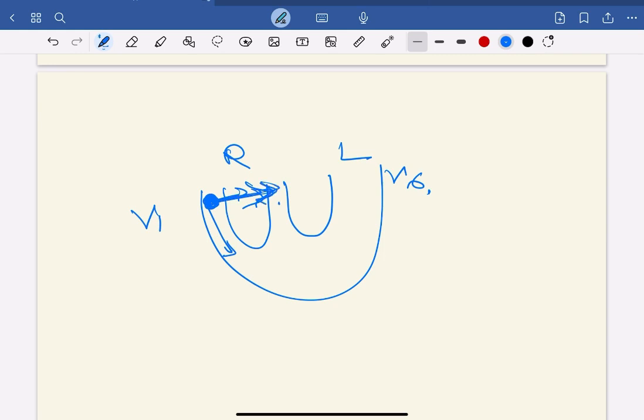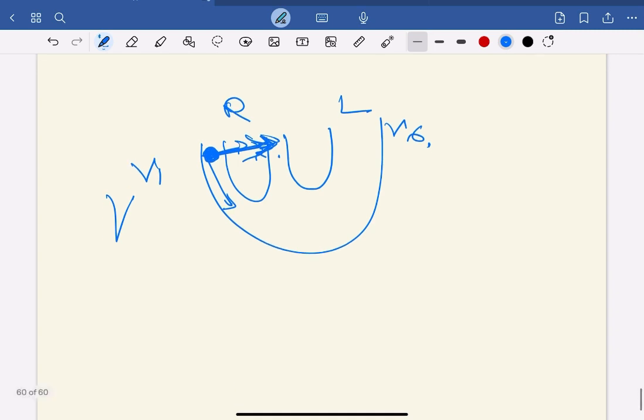One basic thing I want you to remember is whenever the current goes away from the electrode, it is perceived as negative. Whenever the current goes towards the lead, it is perceived as positive. So in V1, if the QRS complex is predominantly downward, that is a deep S wave, that means the focus is on the right side.